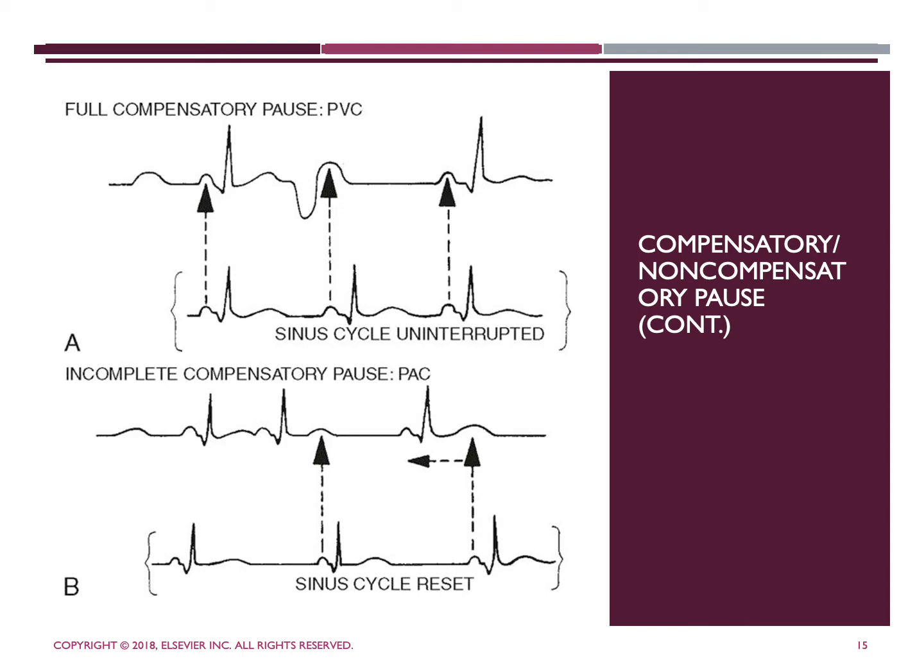In B on this picture, a premature atrial complex, or the PAC, what we were just talking about and looking at on the ECG strip, is often going to be followed by a non-compensatory or an incomplete pause. So you can see the difference here between A and B. Our top one, once again, is a full compensatory pause, where B is an incomplete or non-compensatory pause.